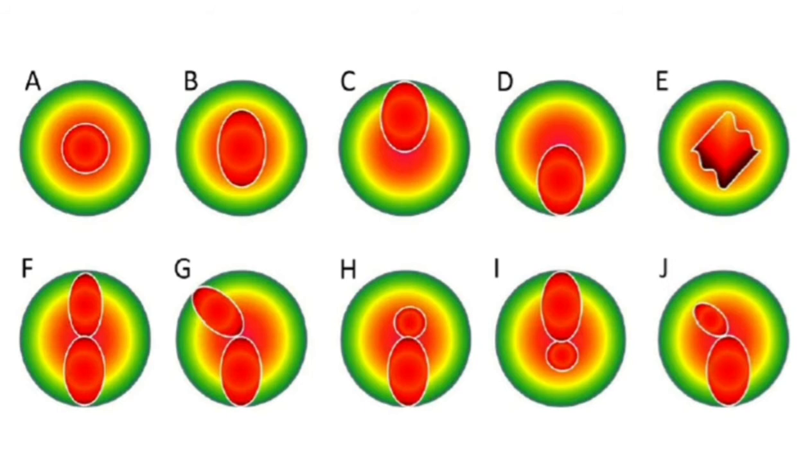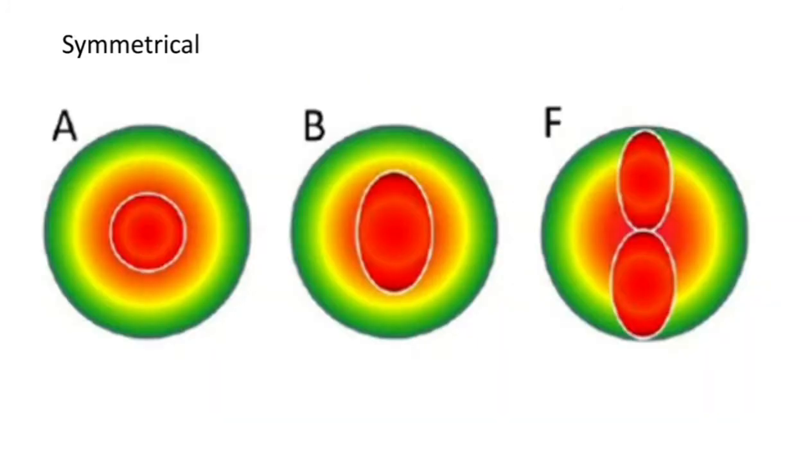So, as I was telling you all those things, I have mentioned symmetric pattern, asymmetric pattern, skewed pattern, and special patterns like irregular and the butterfly pattern. Symmetrical patterns are round, oval and symmetric bow tie. The symmetric bow tie in the vertical meridian tells that the vertical meridian is steeper than the horizontal meridian, which is what happens in a normal cornea. So, it indicates with-the-rule astigmatism.